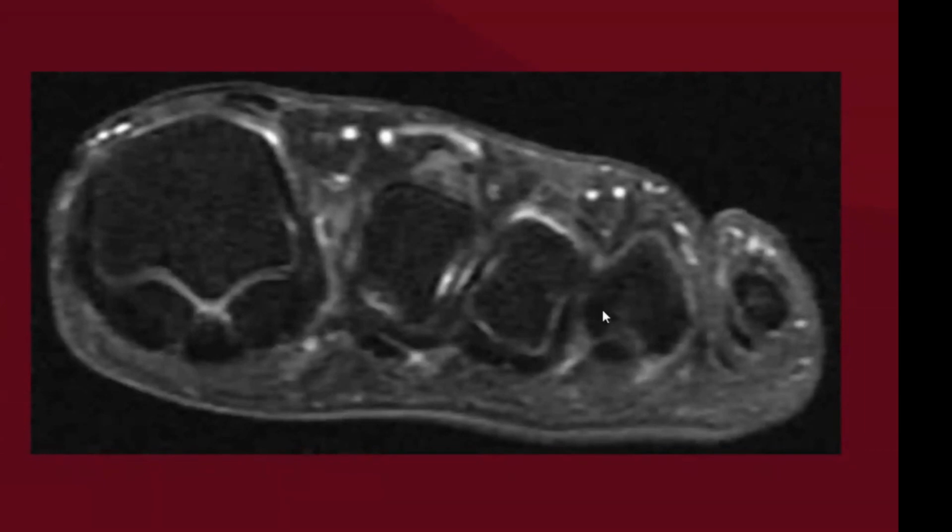And here we can even see some of the attachment of the phalanx, so the plantar plate phalangeal ligament at its typical triangular shaped proximal phalangeal base. And of course, just to throw in for extra, there we can see our sesamoid complex, the flexor tendon, and of course the collateral ligaments and the accessory collateral ligaments reinforced with the beginnings of our first plantar plate complex beginning at the metatarsal side.